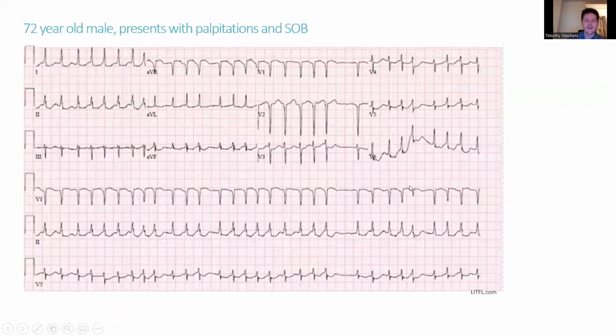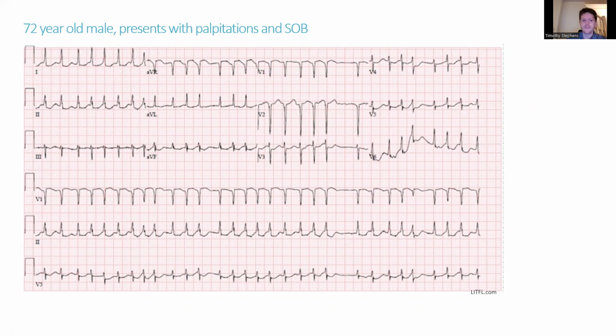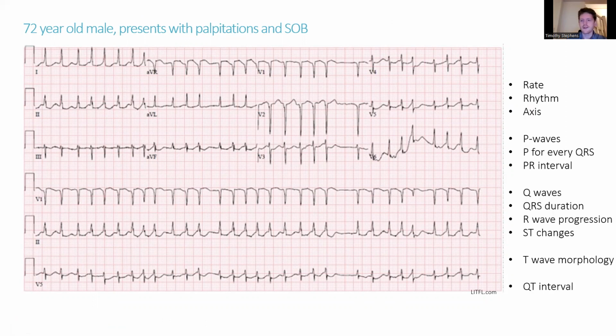Let's move on. Next ECG. Does anybody want to have a go at trying to interpret this one at all? So I'll tell you what, I'll include this on here to help you out. To maybe encourage somebody to have a go.